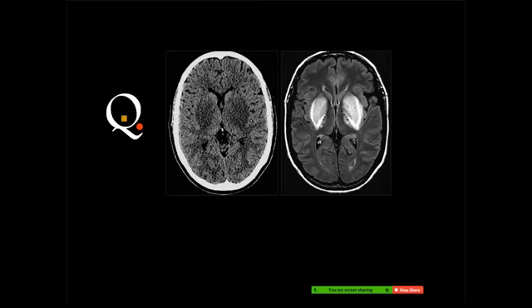Basal ganglia infarction. Bilateral basal ganglia infarction is frequently seen when the internal cerebral veins are thrombosed. But here you do not see any sign of internal vein thrombosis. All we can say here is that we have bilateral, almost symmetrical basal ganglia lesions, and these are subject to a big list of differential diagnoses.